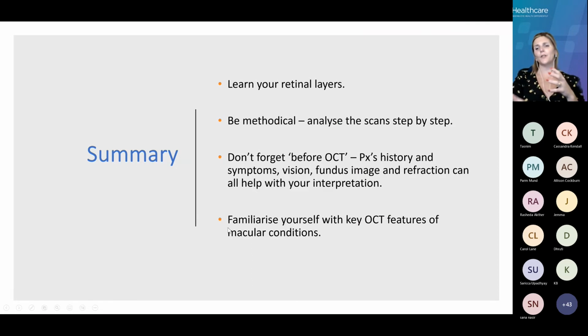So really, just before I show you a couple of cases, we need to learn our retinal layers, but not to the detriment that you're bogging yourself down, but to probably the fact that you understand where the sections sit. So the intraretinal, the sub and the sub-RPE sections, that helps you to be able to talk through that with your colleagues, to be able to do it with your referrals, and also for you to have the understanding of where you may find the different pathologies in those sections.